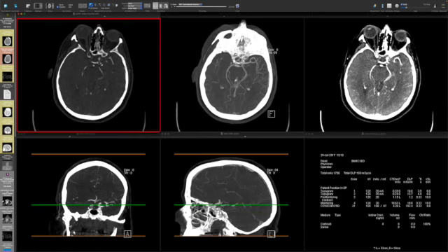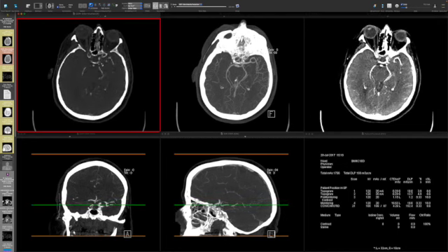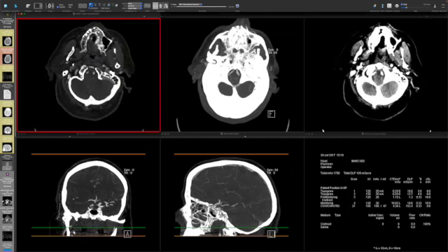So this patient has a 2 millimeter PCOM origin aneurysm arising from the supraclinoid segment of the left internal carotid artery. Anyway, the left internal carotid artery is patent. We've noted the aneurysm. And so now we're going to go and look at the distal right internal carotid artery. And hopefully right away, you realize that when you go and look for the distal cervical segment of the right ICA, it's not there at all.